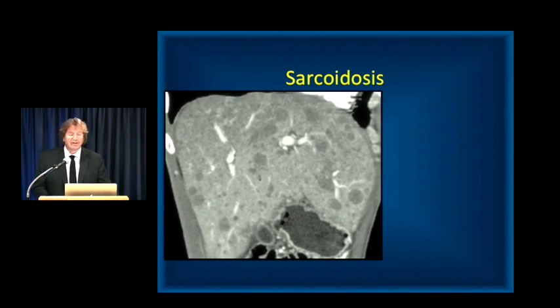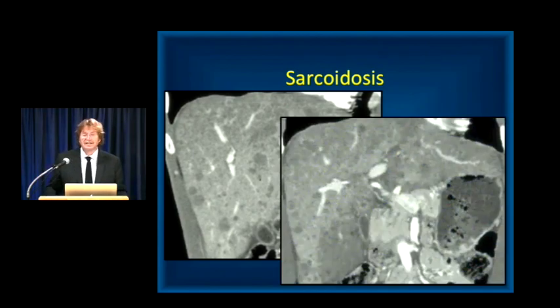Nobody was thinking of sarcoid. The same thing in this case. And I've seen that in healthy young women, people in their 20s and 30s. So it's something indeed to think about.